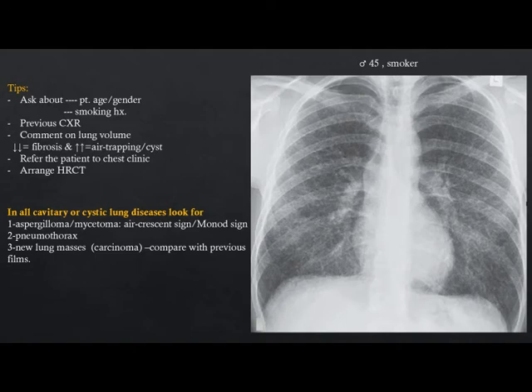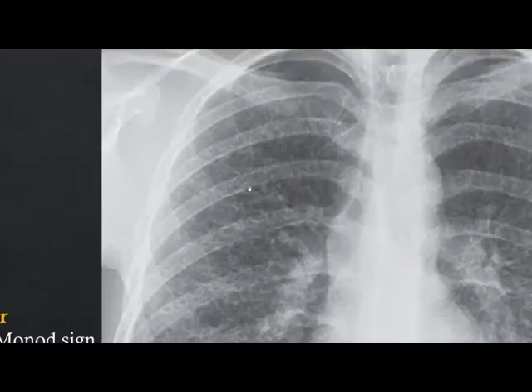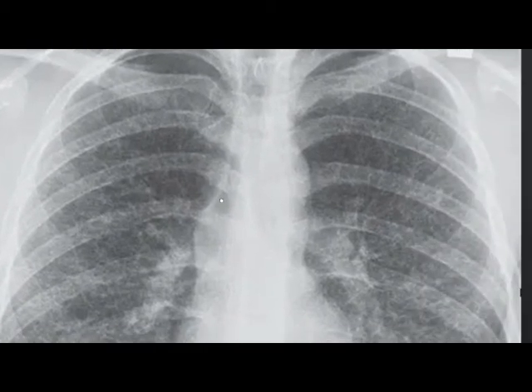Okay, so this is a new presentation. This is a chest radiograph of a 45-year-old male with a history of smoking. There is bilateral symmetrical interstitial thickening. There are some nodules, and if we zoom, we can see those nodules here and here, and maybe some tiny cystic changes.